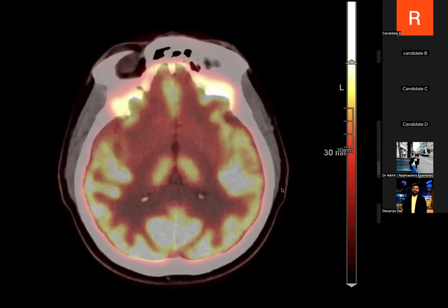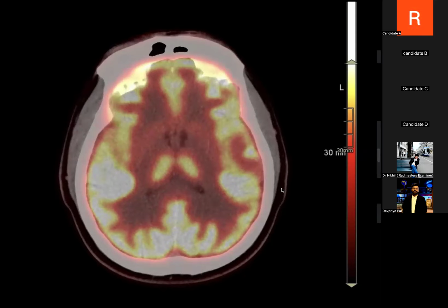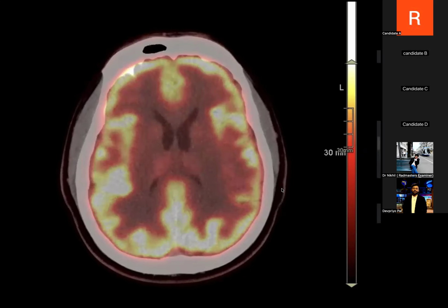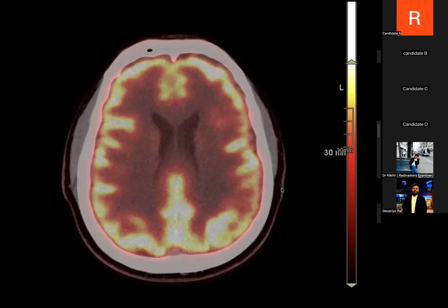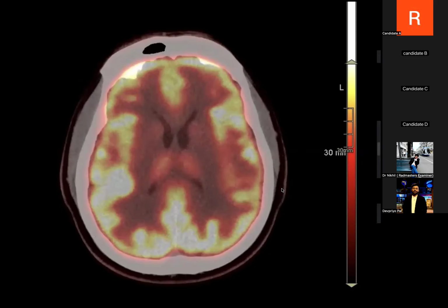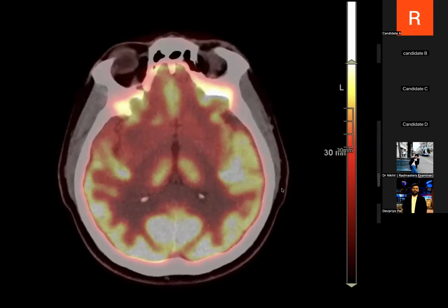Are you trying to say it is spared, or what would be the right terminology when you're looking at a PET imaging? Photopenic areas. Okay. So what does that signify? Does that signify something from a physiological standpoint? What do these bright signals mean on a PET imaging?